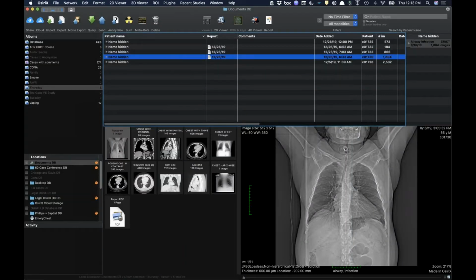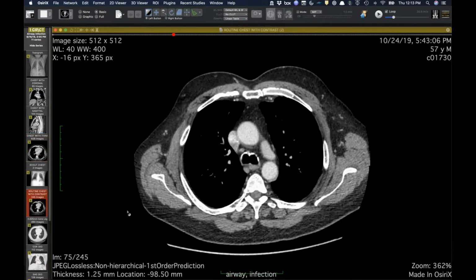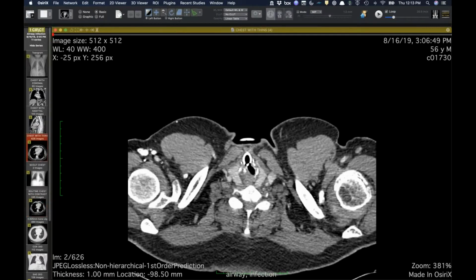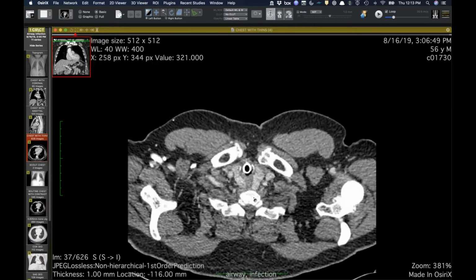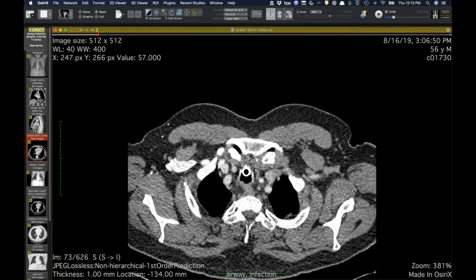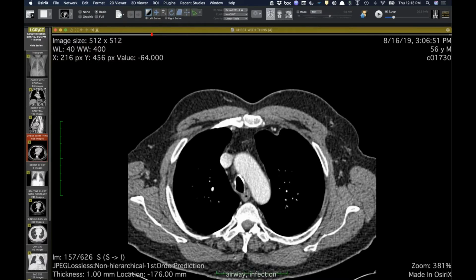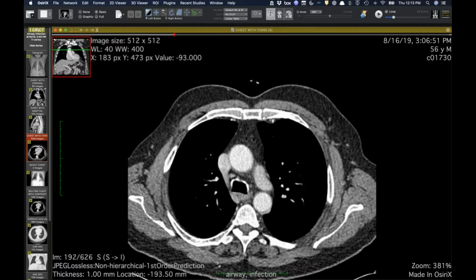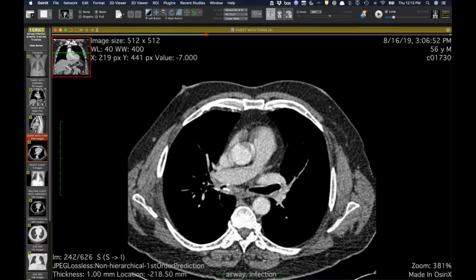All right. Let's see. Oh, this is a very interesting one. So this guy was transferred in with a history of endobronchial tumor. He's trached. He is a drug user, had an overdose a few years ago, ended up with a prolonged intubation, subglottic stenosis, chronic trach. And I think he's still an alcoholic, is not using any other drugs, but then for some reason at the outside hospital got a CT, and this is the one that he had.